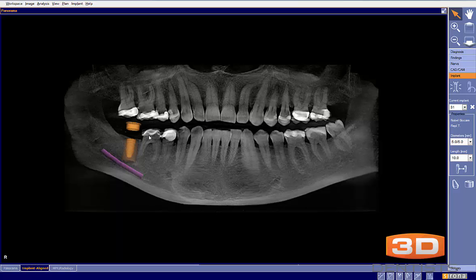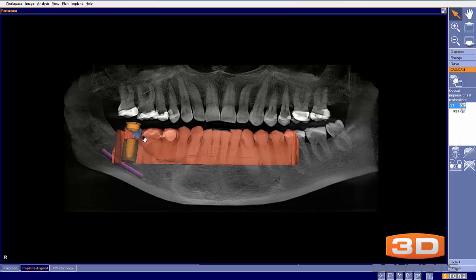And the first thing I see is that this is a digital workflow. The digital workflow would then allow me to do OptiGuide, DigiGuide, or a CEREC Guide 2 milled in office. Since we know exactly what we've got to do, we need to bring in our CAD/CAM data. There's our restoration. There is our tooth data. And the great news here is we have all the data that we need for cross-arch stabilization. So we have OptiGuide as an option, DigiGuide as an option, and enough data for a CEREC Guide 2 as our option. So now we have everything that we need.